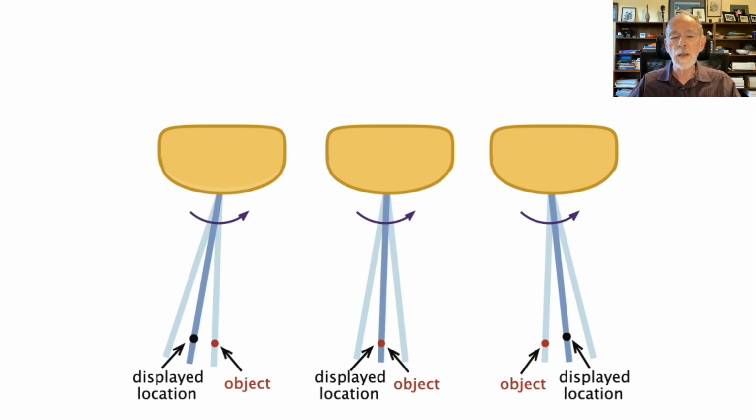Once again, the machine displays it at the correct depth, but now it's going to be displayed to the right of its true position. So the result of this is that the object will be displayed 3 times. Once in its correct location, and then there will be faint copies of it to the left and right of that location, equally spaced.